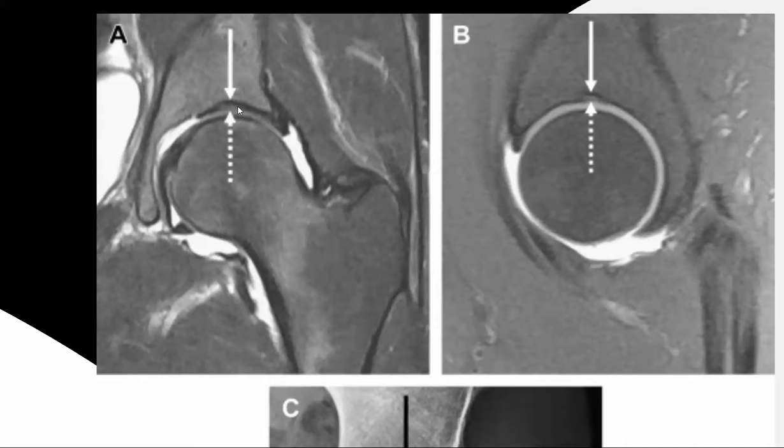In the weight bearing portion of the superior acetabulum at approximately 12 o'clock position, there can be a normal variant called the supraacetabular fossa. We see this quite commonly. Please do not mistake it as pathology. There's no surrounding marrow edema. We would see that as bright on a fat suppressed sequence.